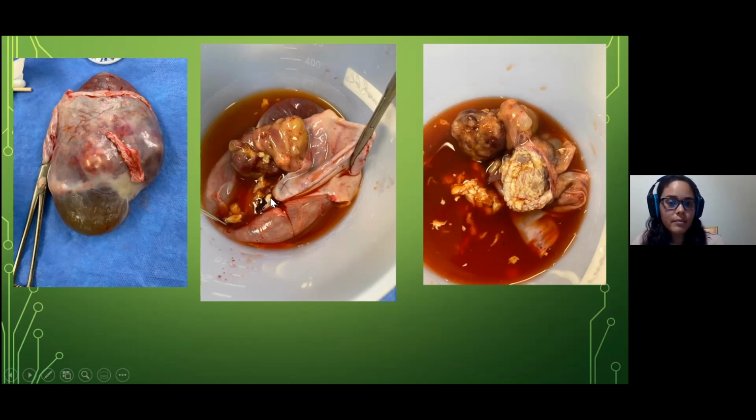And I know that it's difficult to pick it up from an image, but they told me that these were really, really hard calcifications, right? I know that we think of teratoma and hair and teeth, right? The masses. So one of these could be the teeth components. So yeah, fat and all the fluid in there.